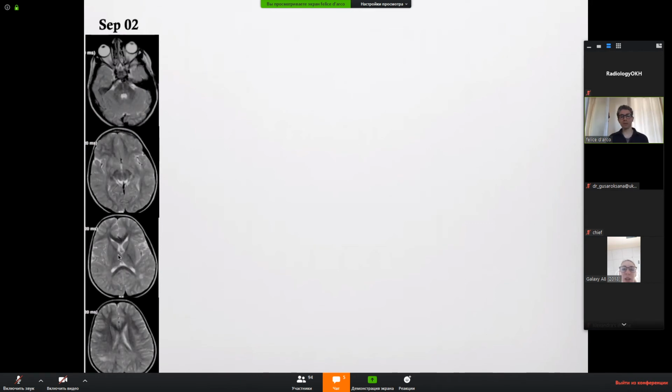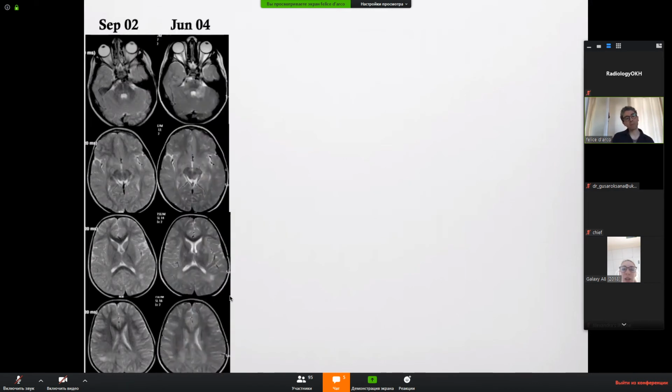Dr. Hacohen and Dr. Mankad. September 2002, patchy abnormality in the white matter. Okay, you can see here. You can see here the child was encephalopathic, ADEM. Okay, fine.